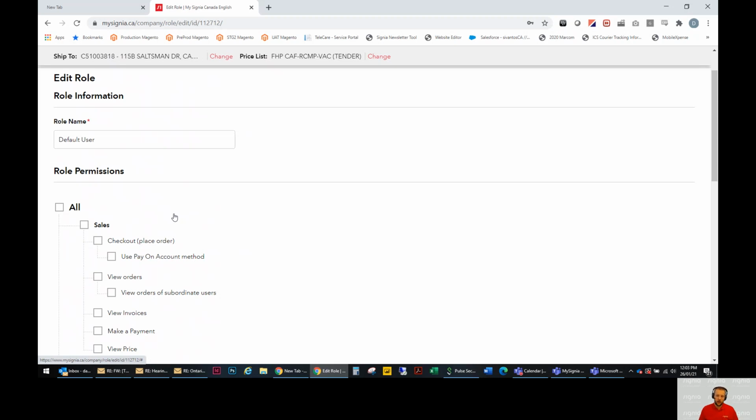So when they open up the box, the invoice is there, as well as they can view pricing of hearing aids. So the price of a hearing aid online is not the statement price. So I just want to be clear with that. It's the invoice price. So if you have invoice discounts, then here you may not want to allow your employees to view that price. But if that's not an issue, then go ahead and allow that. But just know that if your discounts are only on statement, then viewing price would be the same thing as today. They see it in the price guide when they call us. They see it on the third-party tenders as well when we email those out.